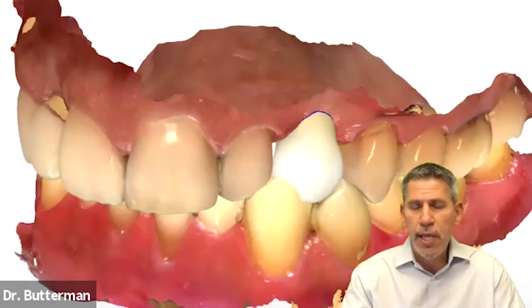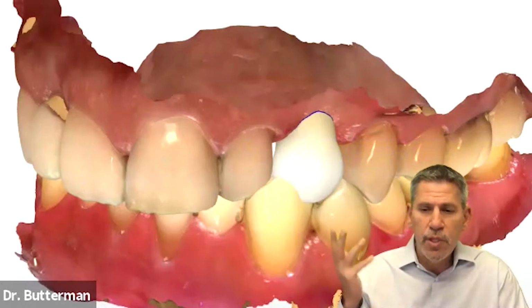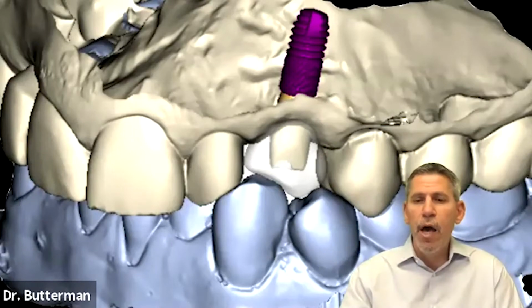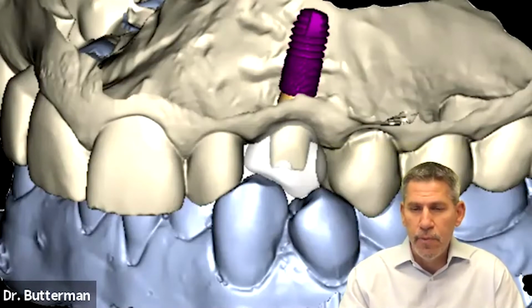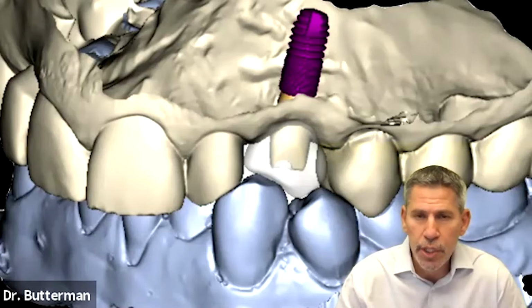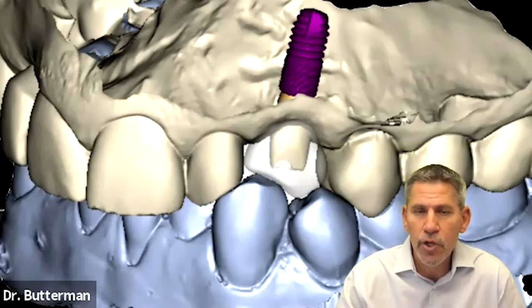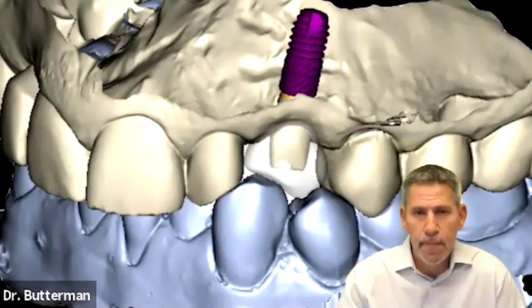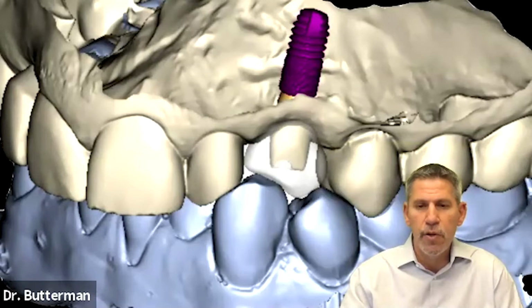And what do our patients always say? They always say, no, there's no way I want to go into braces. But you show them something like this, and then I can show them, well, that's what your final crown is going to look like. You're going to spend a lot of money for an implant and a crown. And if you're cool with it looking like that, I'm all good, let's go. And most of the time they're going to say, well, no, that doesn't look very nice at all. Because you're looking at what the final result is. And then I get to say, well, it's your choice. It's either that or you move your teeth out of the way and we can have a proper looking tooth. So that's a much easier conversation. And this patient did ultimately go into orthodontic treatment so that we could get a good result for this case.